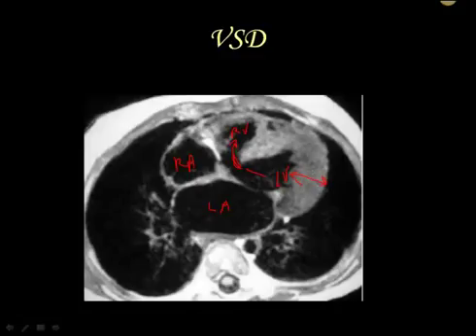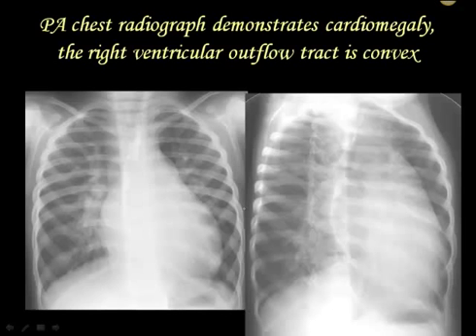So this is a reactive thing on the same idea as if you were out there working out, pumping those 15-pound weights or whatever it is that you do, and you could develop deltoid muscles and biceps. Same thing's going on here. Now there's another issue potentially going on here as well, which is the size of this left atrium. I'm not entirely sure how to speak about that except for the fact that it just looks big to me. There may be other things going on.